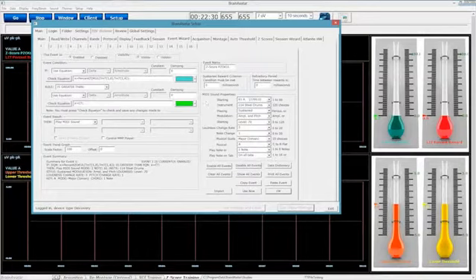One of the nice things that's also kind of convenient to the BrainAvatar software is you can actually control what tab you're going to do this on. For example, most of ours are set to on all tabs. Let's say in this protocol, I only wanted the Zscore training to occur on my Zscore training tab. I can go to main tab 4, then this reward sound right here is only going to happen when I'm on this page right here. And if I'm on another tab, you're not going to hear it at all. So that's a little flexible feature you have on there.